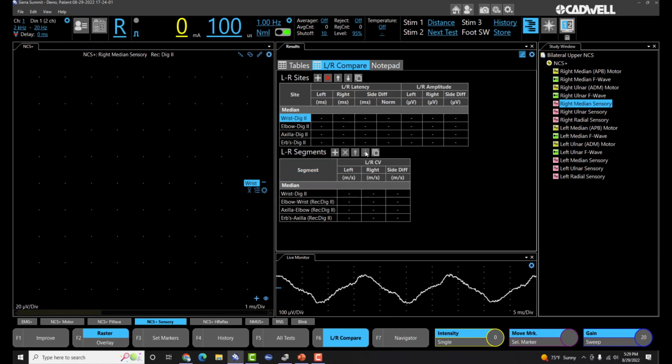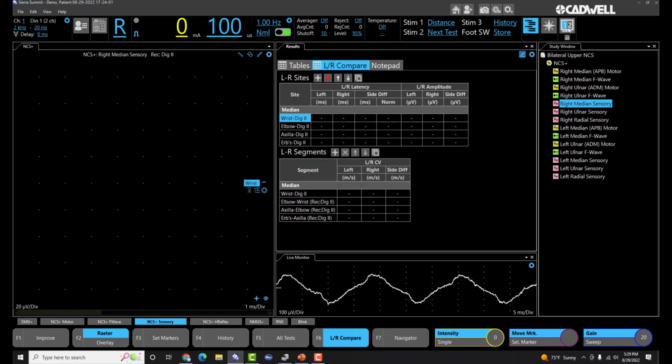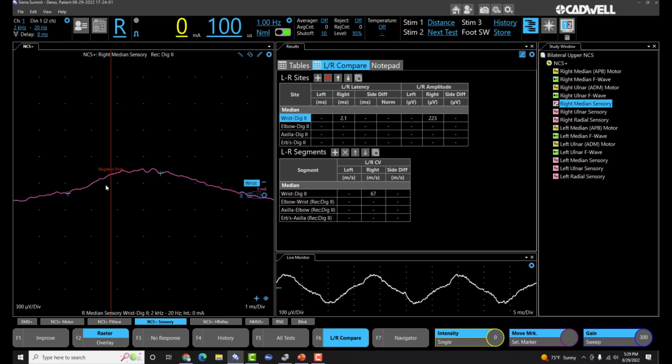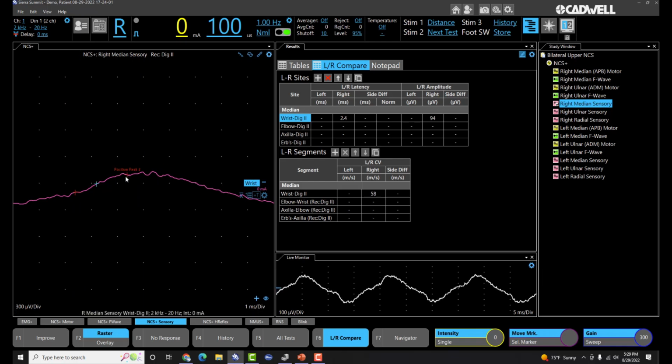That way we don't have to redo that again in both views. If you don't use view 2, it doesn't really matter. I usually like to keep them both the same though, just so that there's no confusion. At this point, it's always good to go ahead and just test your parameter. So just stimulate something and get a result on there, so you can make sure all the right numbers are showing up. When you change cursors, make sure the right numbers are registering the cursor change.